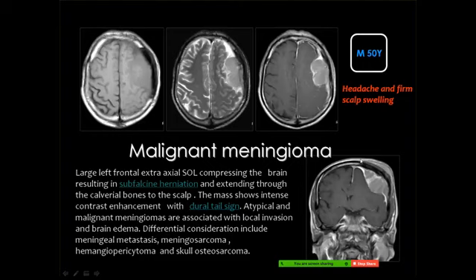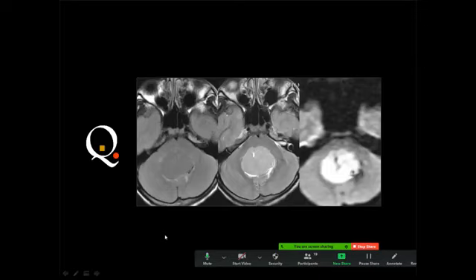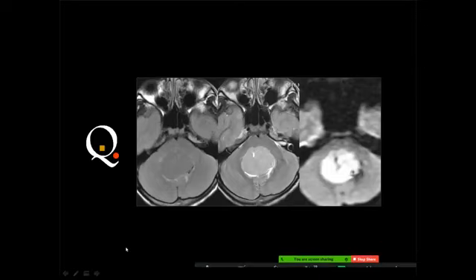And this term is an old one, which indicates a malignant meningioma. It's no more used, but the term atypical meningioma or meningioma grade 2 or grade 3 is usually the preferred term nowadays. It is enough for you to say that this is an atypical meningioma, or even to say hemangiopericytoma is good. But whenever you are asked about the differential diagnosis, you should say lymphoma and metastasis.